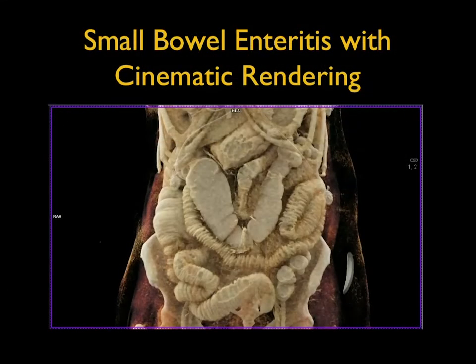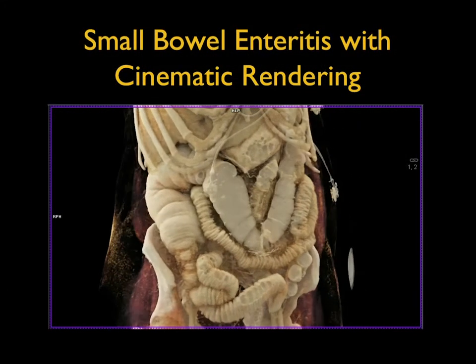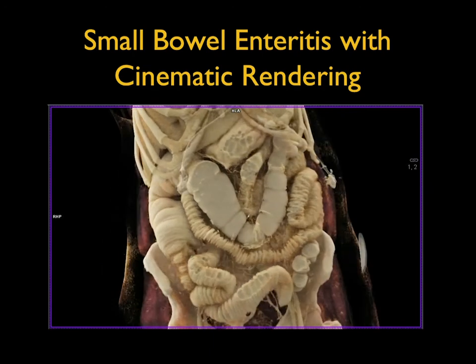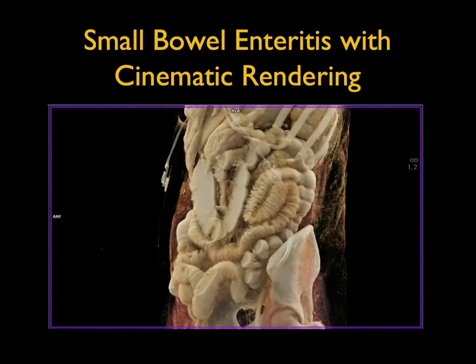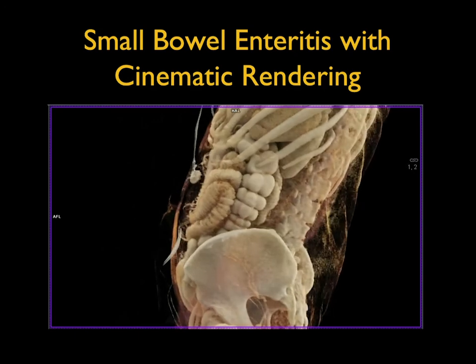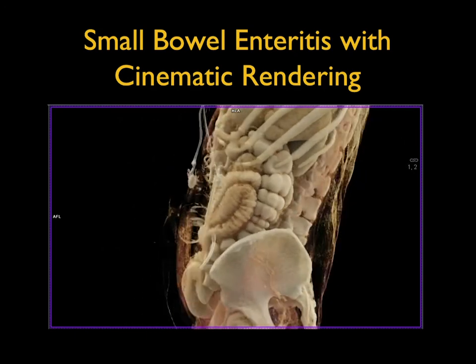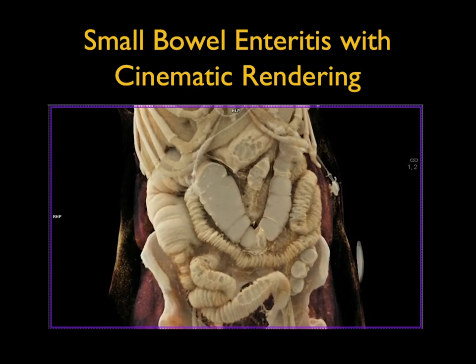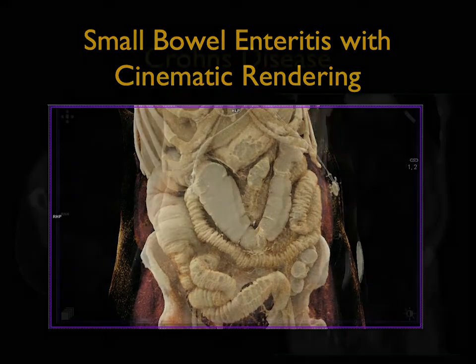And here's just one good example, again, showing you the image rotation. And you can see very nicely the kind of detail we're able to create. And again, I wonder if we can push this forward to get better small bowel and better large bowel studies. So I think it can be very exciting in that regard.